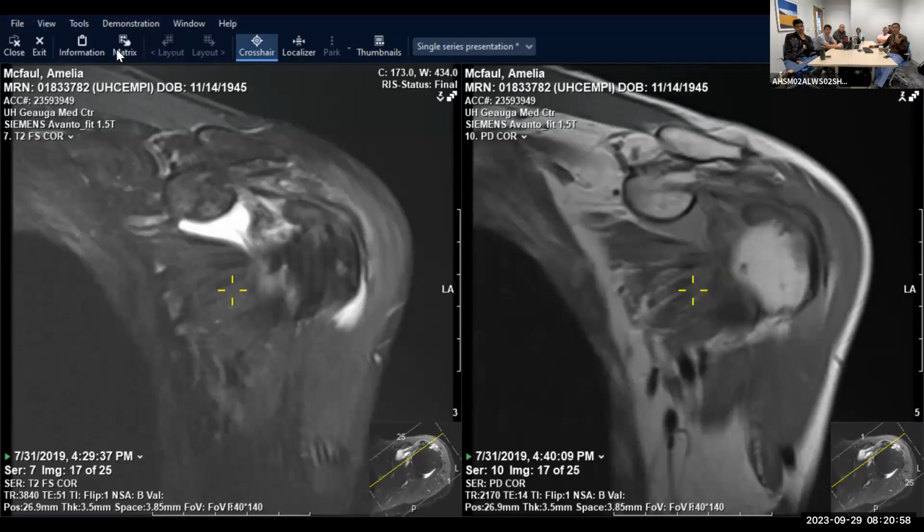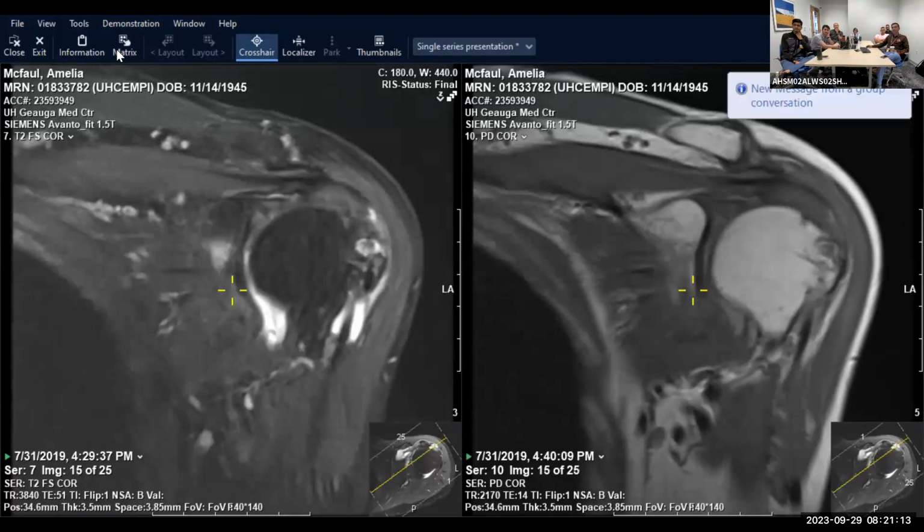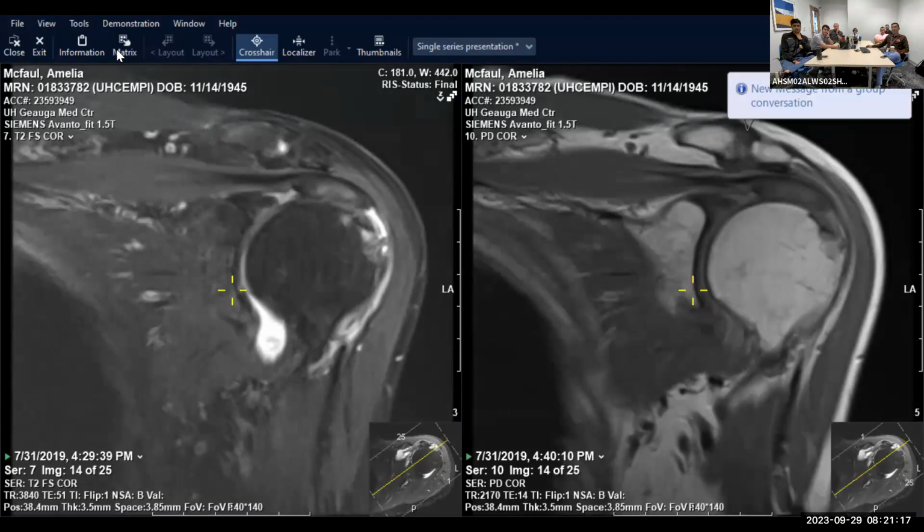And that's one of the more commonly missed cuff tears, is the leading edge of the supra. So you want to really scrutinize this area, make sure you're not missing any articular surface tear, because the low grade articular surface tear, far anterior insertional supraspinatus, we call the rim rent tear, is the most common tear and also commonly missed. So we just want to make sure we don't do that. You can see this tendon is pretty ugly looking. It's a little thick. It's got increased signal intensity. And so this has definitely got some at least moderate tendinosis, I would say.